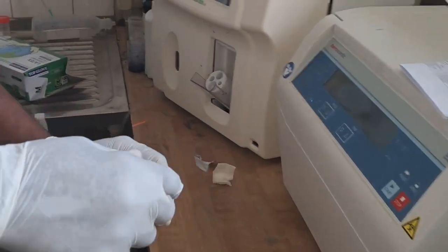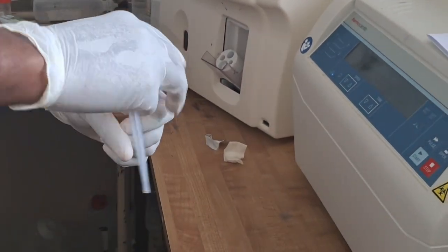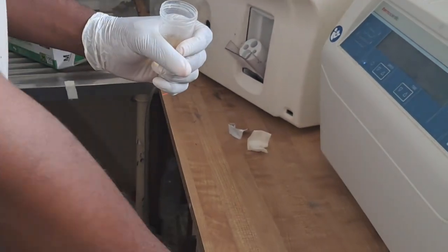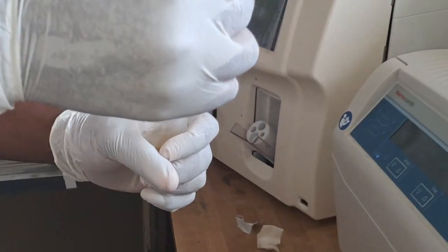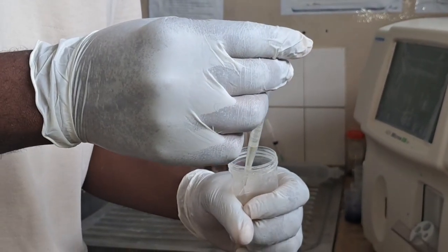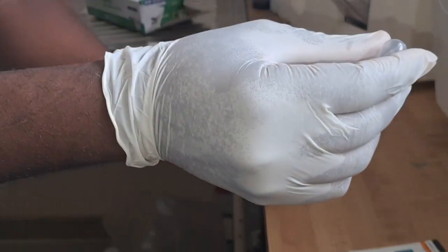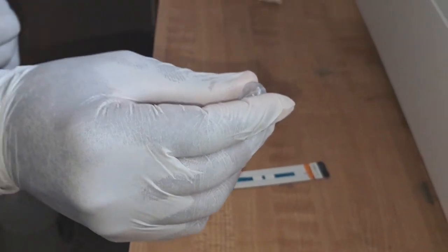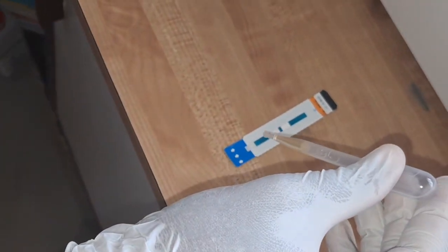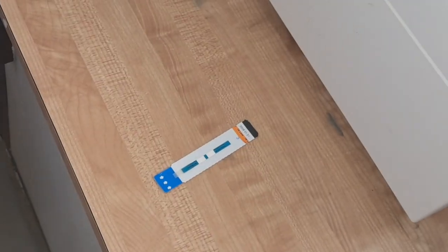Infection prevention, even though they say urine is most sterile. So we'll get one big drop. I have collected a lot of urine. Then I'll put one big drop like that.